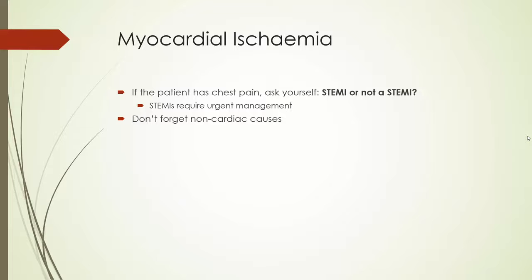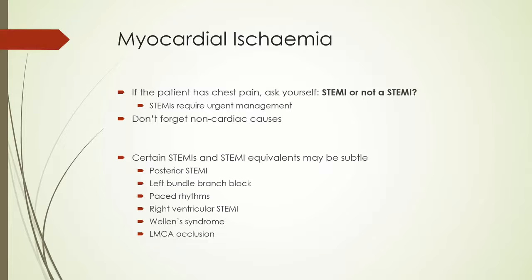Now, most STEMIs are pretty obvious on the ECG, but sometimes they're not. So, for example, a posterior STEMI is not always that apparent, and these other ones are also not so obvious. So we're going to work through the basics and then each of these special cases one at a time.